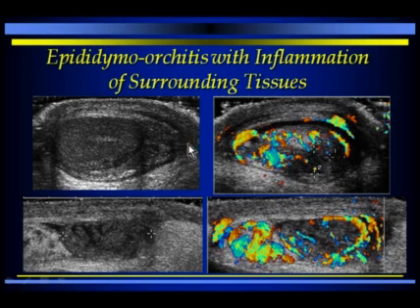Another case of epididymal orchitis: testis, increased flow. Adjacent to the testis is the epididymis here with increased flow. And look at the planes of the tissue surrounding the testis. The scrotum here is very thick-walled. So we have epididymal orchitis with inflammatory changes in the scrotum and a very small hydrocele here between the scrotal wall and the testis. See that hydrocele is anterior to the testis but does not appear back here behind the testis.